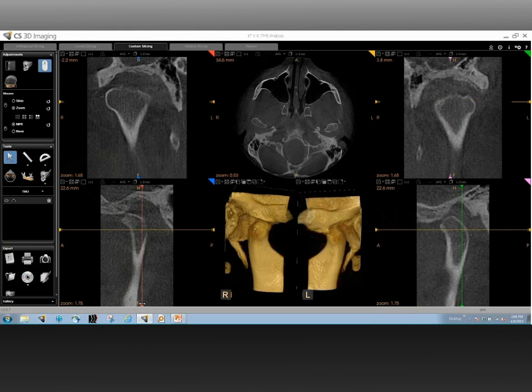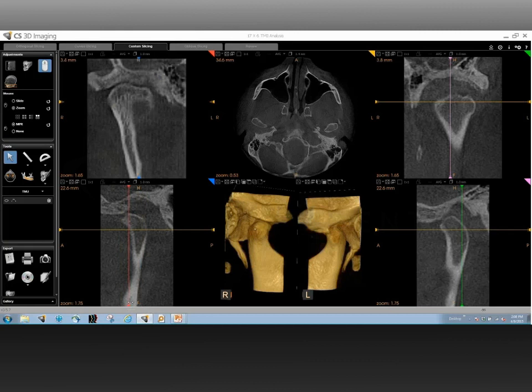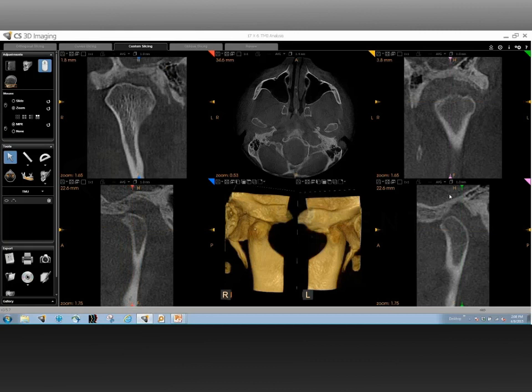And then I probably would stop over there and show you that there's a remarkable loss of the cortical bone on the superior head of the condyle right there as we go further back posterior. And just to complete, we look at the entire posterior surface as such. Now, that is the anterior-posterior view. Of course, now we have the advantage of actually seeing the lateral view.